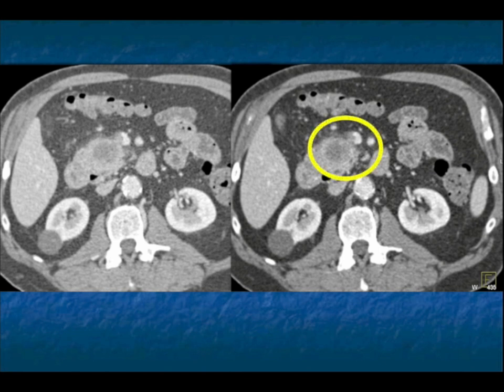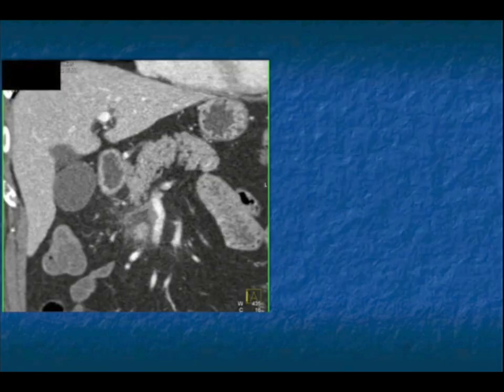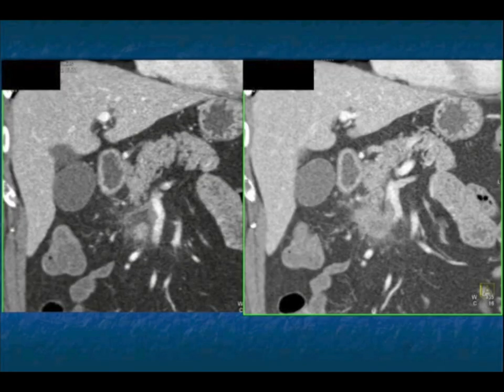So vascular involvement is no longer what it was before as a classic stop the presses, do not operate. Depending on the extent, patients will get operated on. Typically, they'll get chemotherapy first to try to shrink the tumor, particularly away from the vessel, and then they will operate. And again, nice examples here showing you that same mass and showing you very nicely the SMV involvement.